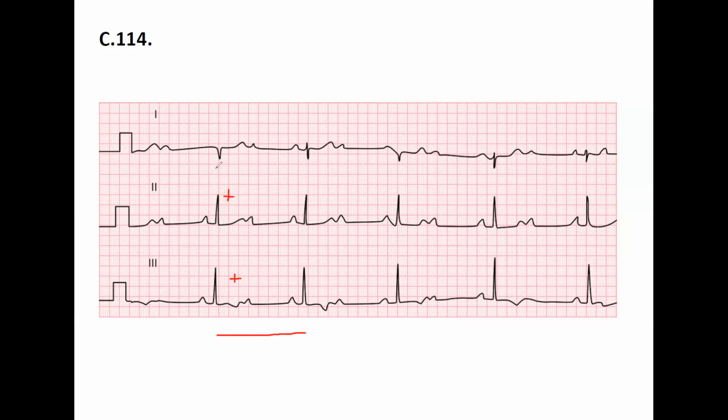Wait a minute, if you are looking at the P waves, they are a bit strange, changing. As you see here, in lead number 1, the QRS shape is changing. See? This is because of the breathing and diaphragm. So this is a little bit negative. So your rate is close to 100, so 90, 100. This is what we have. Okay, now you can go on.